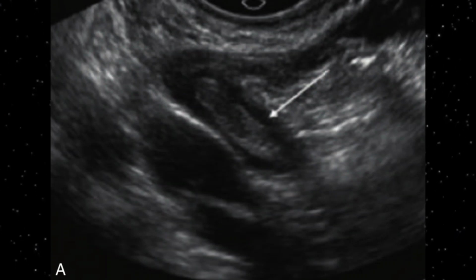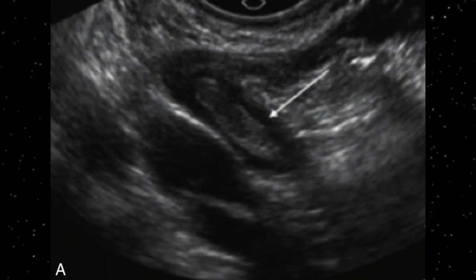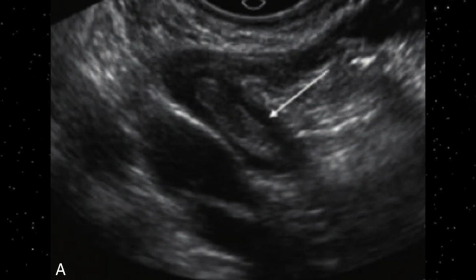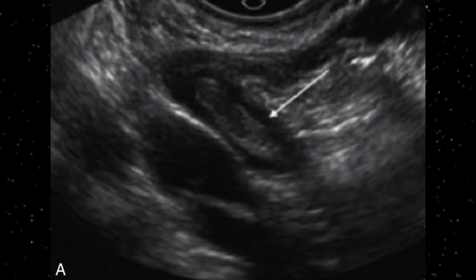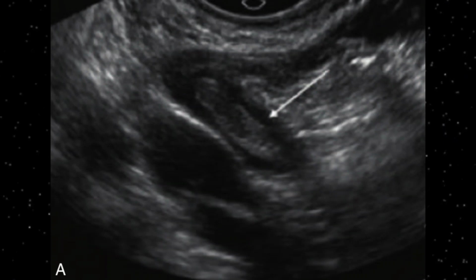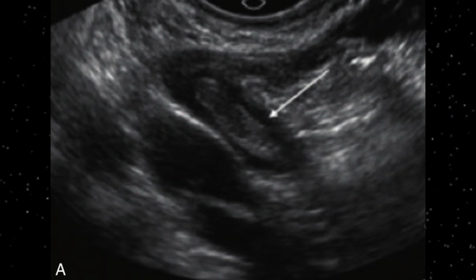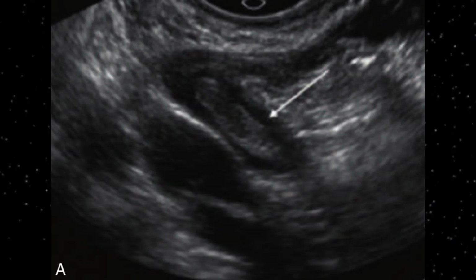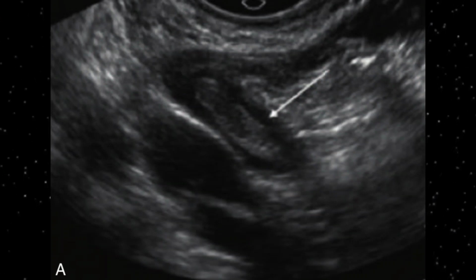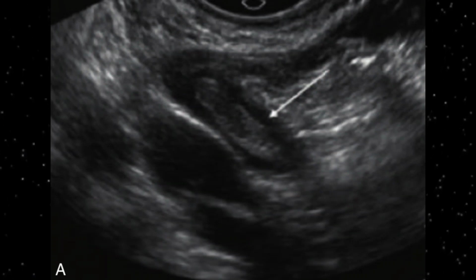In other words, another term we can also use for this image is thrombophlebitis. Whenever a vein is filled with thrombus, if it is not a deep vein, otherwise you would use the term deep vein thrombosis. But as these are superficial and smaller veins, the best word is thrombophlebitis, because it would be associated with a surrounding inflammatory area.